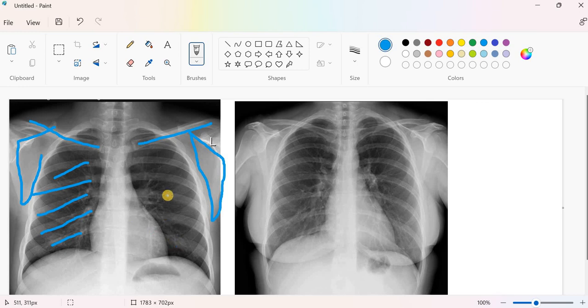And then after that we can identify also the vertebral column, the vertebrae. As you see, these are the vertebrae. This is a transverse process. Here we can identify and so on. So usually the bones appear from very light gray in color in the chest x-ray to white, especially here, because here there is overlap between the vertebra and the heart with its own filled chambers of blood. So wherever you have overlapping tissues, you will have more bright white appearance. So this is regarding the bones.